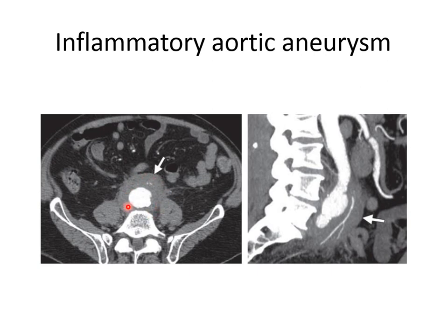And the other important point is that it spares the posterior wall. So the inflammatory aortic aneurysm has two important things. It is an aneurysm caused by inflammation, but it is accompanied by perianeurysmal fibrosis that spares the posterior wall of the aorta.